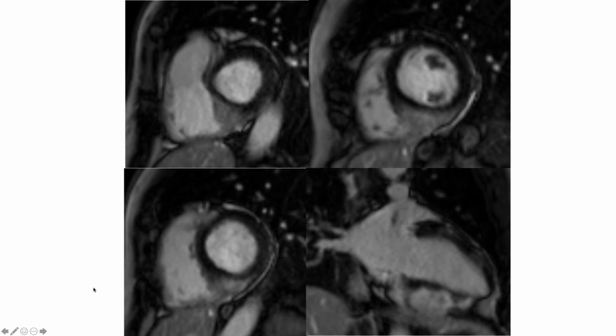And I'm just going to move on to the perfusion, the four-chamber view, which shows no significant enhancement early on, no significant increased perfusion, but then on the delayed gad, there's mid-myocardial and transmural patchy delayed enhancement in the septum, and also in the inferior septum here, in the inferior wall on the two-chamber view.